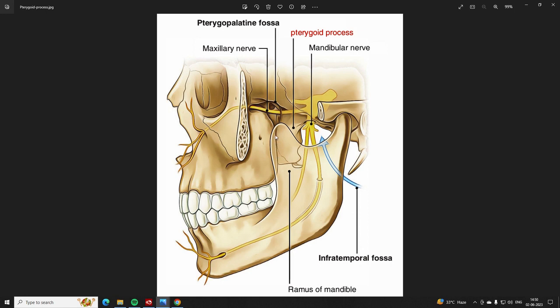So that is the teardrop shaped opening through which we have to enter, but we cannot do any end-on view here because the coronoid process is there. This is not the coronoid notch, this is the coronoid process, and this is the mandibular notch.